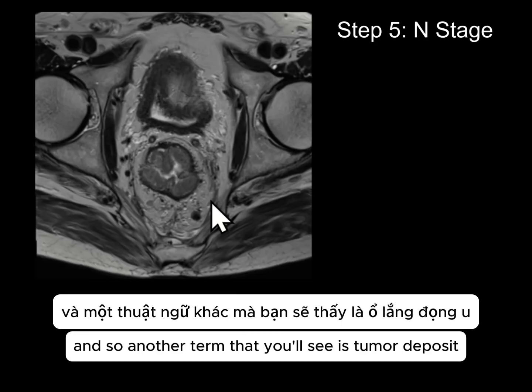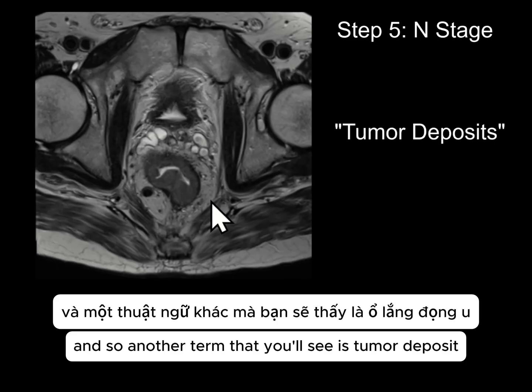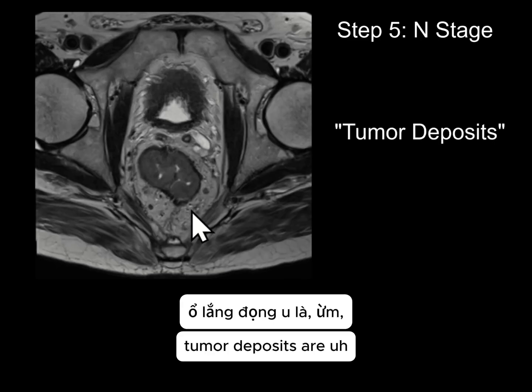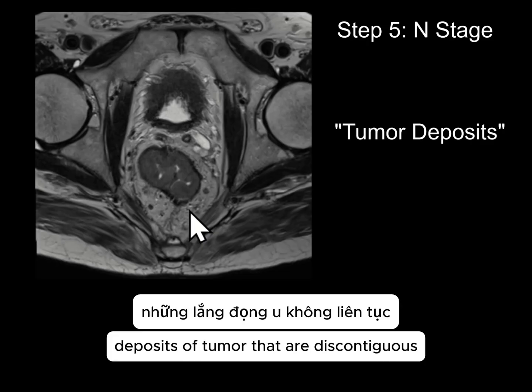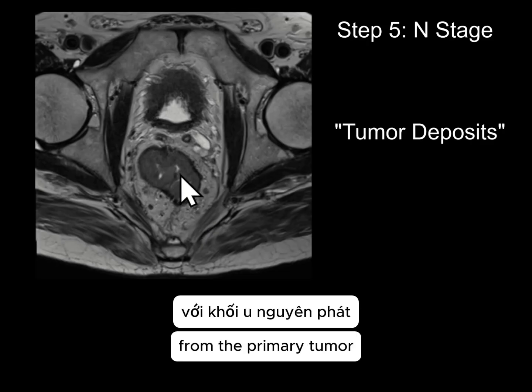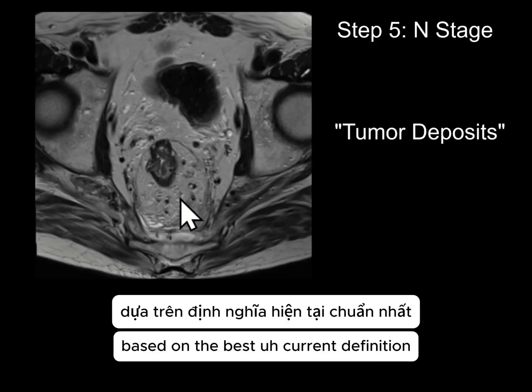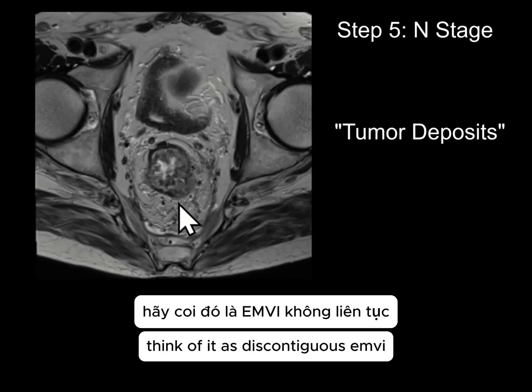Okay, and so another term that you'll see is tumor deposit. So what are tumor deposits? Tumor deposits are deposits of tumor that are discontiguous from the primary tumor that are not nodes. Based on the best current definition, think of it as discontiguous EMVI.